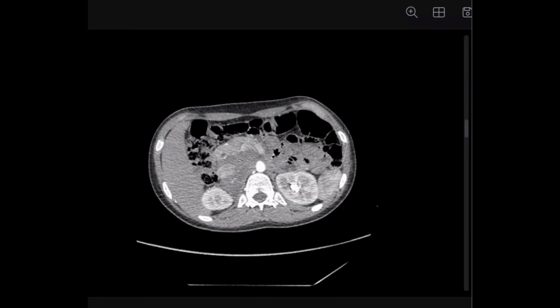Okay, and what else? Then it can be retroperitoneal lymphoma also. Lymphoma, maybe, but it's difficult because it's like one mass encircling. But maybe lymphoma, yes, it's one of the differentials, but it's not an enhancing mass. It's not similar to lymphoma really. But it's one of the differentials. Okay, what else?